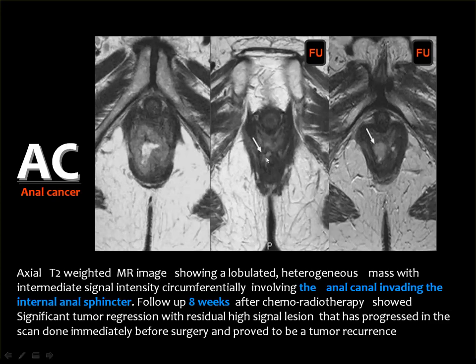Then the follow-up after 8 weeks showed significant improvement on chemoradiotherapy, but at the time of surgery, and you know that these tumors are downstaged by preoperative chemo irradiation, then they are removed to enhance the outcome of surgery.